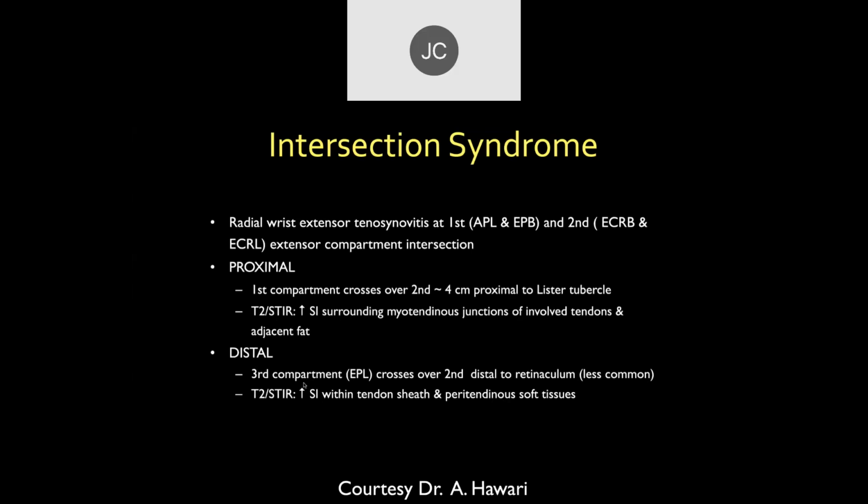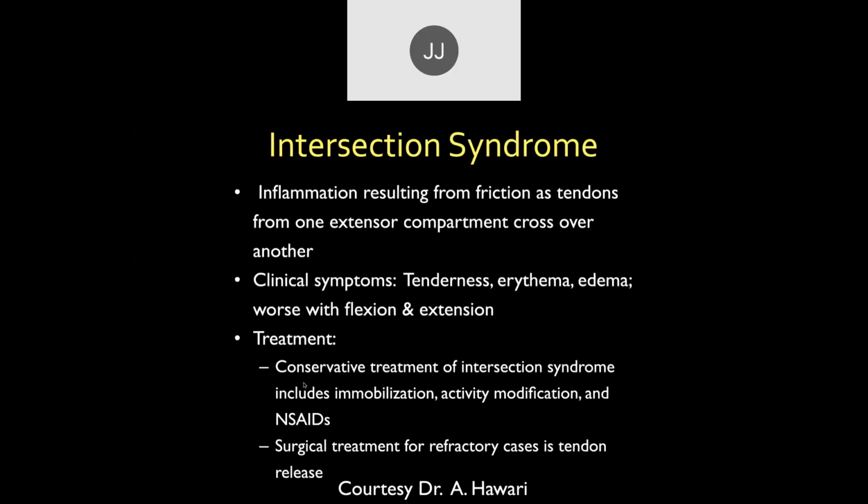John? I'm not sure I would use the word a lot of fluid. Okay, what would you use? I would say there's fluid. Okay. All right. And then I guess a diagnosis, synovitis or something of that sort. All right.